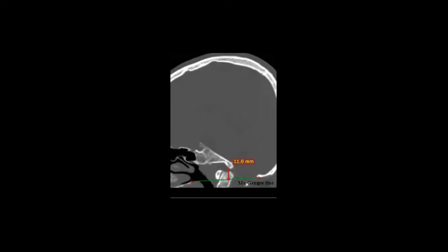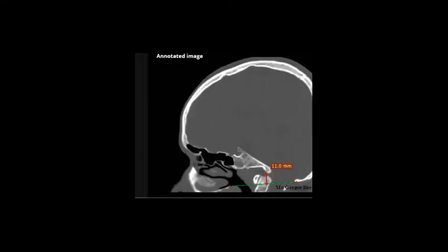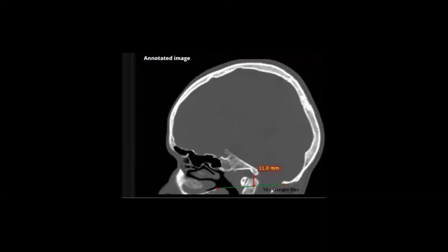Yes. So this one is a typical case of Chiari 1. They like it in the exam. You will find it as a spot case, a typical case. Just read the comment before we shift to another case. Okay.